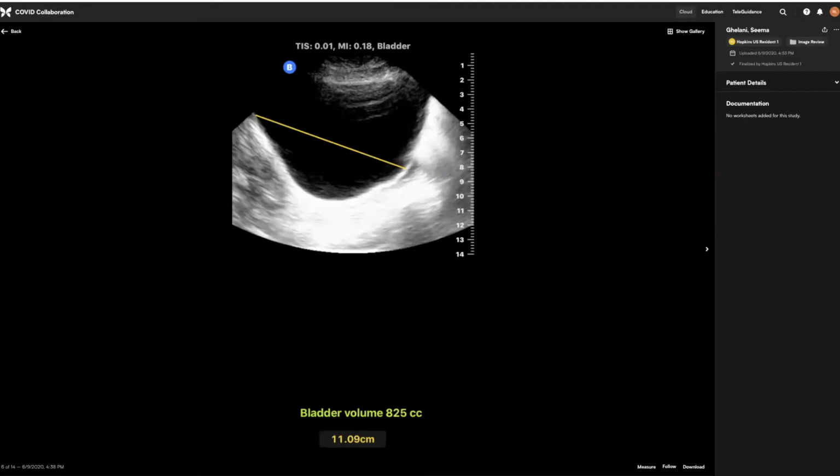So pretty impressive, right? This person probably has to pee a lot at this time frame. And was there an award for whose bladder volume was the largest in this, or that was just incidental? I gotta ask that, but I don't think I've even imaged my own bladder when I've had to pee, so I would be really curious to see how much I can hold. But wow, end of an ER shift, you never know what you could get in there, right.